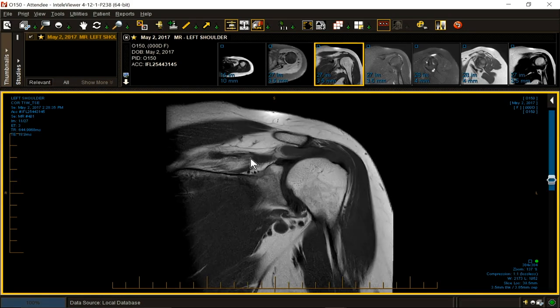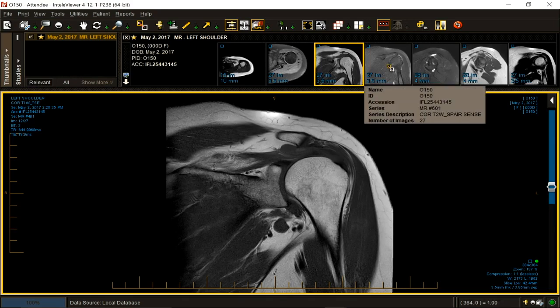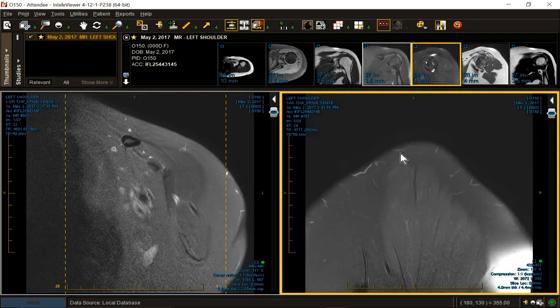We have grade 2 to 3 muscle size loss of the supraspinatus. If this tendon is diseased, fixing it is going to be fraught with challenge. Is it diseased? Let's have a look. That's not why we were doing the study. We were doing it for her lump.